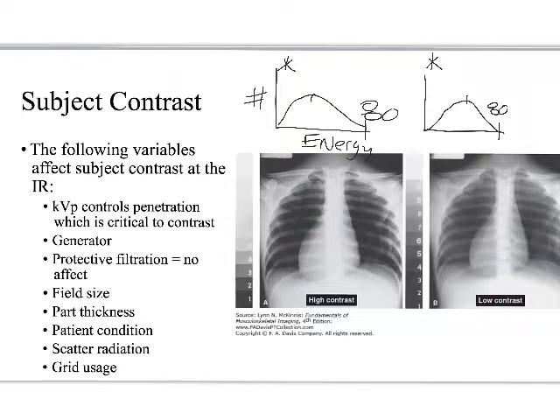So one of the things we're going to be looking at, a continuation of the conversation, is comparative pathology, considering how pathology is affecting the image. That doesn't look normal. The contrast looks funny. Is that something with the technique that I used, or is that something with the pathology that's apparent on the image? So sometimes there's hints there.